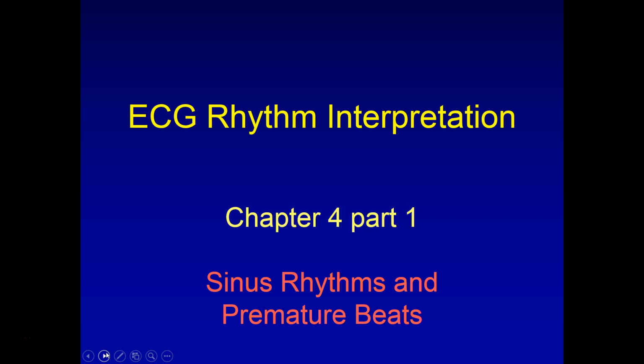Welcome back. We're now in Chapter 4, Part 1 in our video series on how to interpret 12-lead EKGs. In this video, we're going to get a chance to practice our systematic approach to rhythm interpretation. So let's get started.